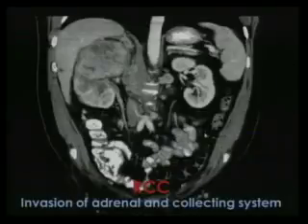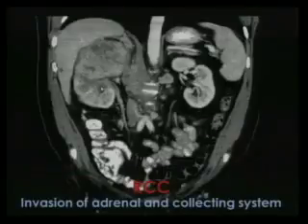This is another example. In this case, we said that if there is invasion of the collecting system. In this case, we have an extensive tumor affecting the right kidney, with invasion of the collecting system and also with invasion of the ipsilateral adrenal. We can see the tumor, how it extends into the collecting system with a crescent-shaped filling defect in the proximal ureter and the renal pelvis.